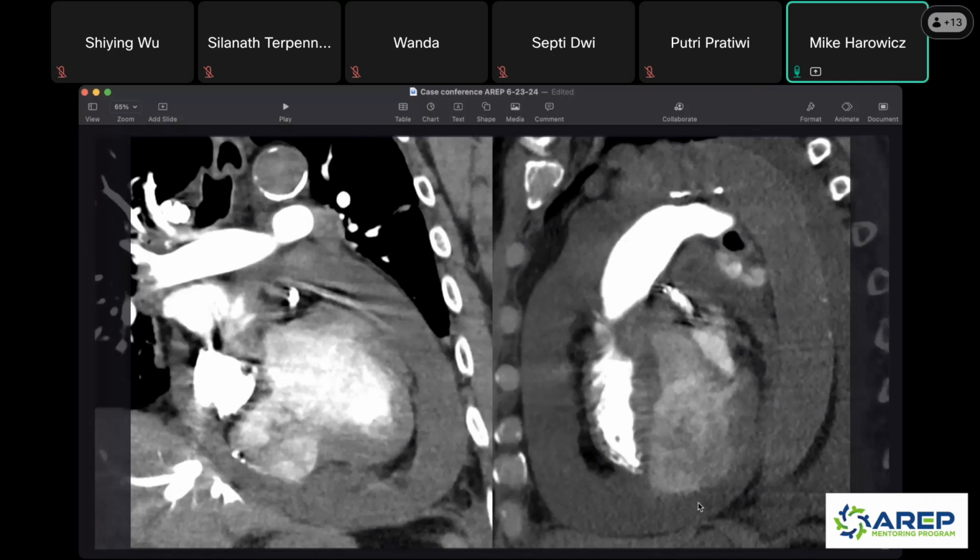Now, all these were in different vascular territories, right? You have your three main coronary arteries. They each supply sort of specific regions of the heart. So different MIs, but the same result.